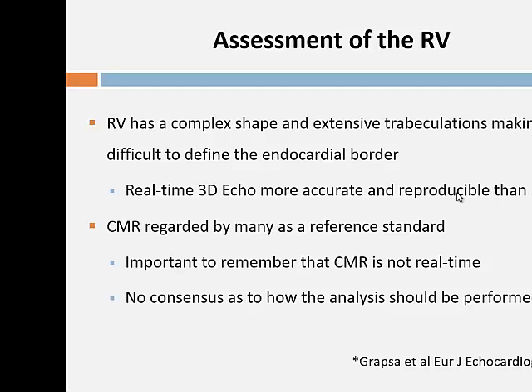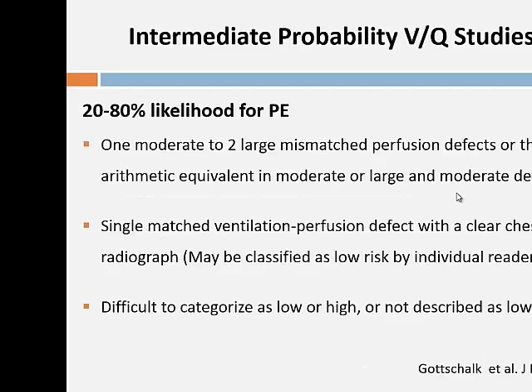And remember, you can get things like balanced shunts, where if the pulmonary hypertension has been that long-standing, you may have started off with a left to right shunt, but then that can equalize and then finally reverse when you get Eisenmenger's physiology. But it's a useful way of estimating, if you've got an ASD, to see what the QP-QS is. You can do it all non-invasively with MRI, so that's very helpful.